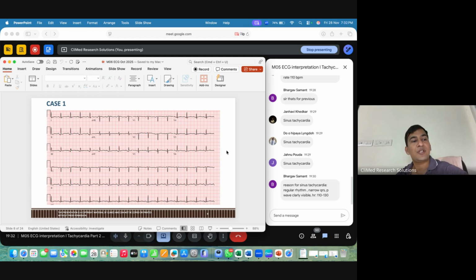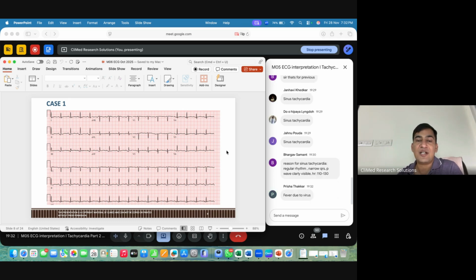So, what could be the reasons for this ECG in H1N1? You have to tell me this. What could be the reason, pathophysiology or anything? His fever was 102 when the ECG was taken, the temperature of the body was 102, and he was diagnosed with H1N1. His heart rate was 110. At that time this ECG was taken. It is completely sinus tachycardia. But why, guys?